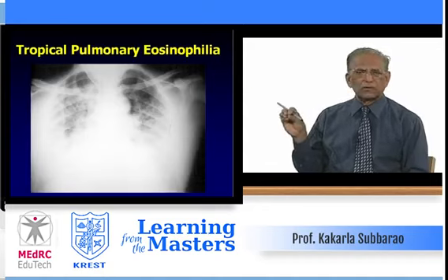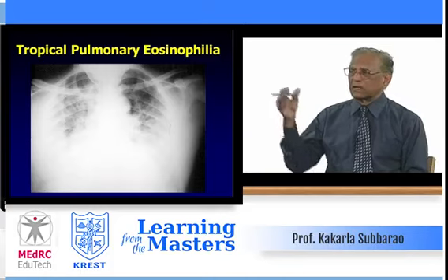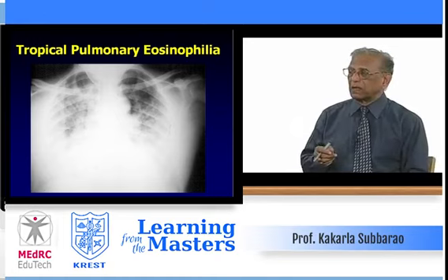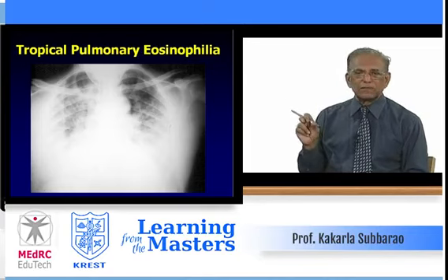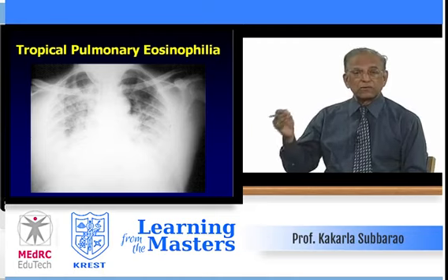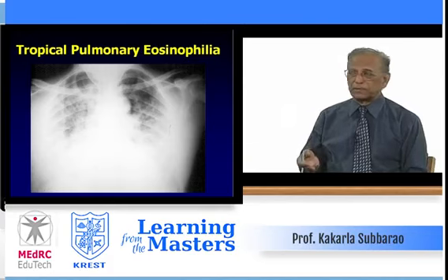This is a 25-year-old woman, comes with dyspnea mainly, loss of appetite, low-grade temperature, and this blood picture shows 70% eosinophils. And then amoebic, pulmonary amoebiasis, pneumonitis with cavitation in the right base. Note that the right dome of the diaphragm in the lateral segment is not well outlined. That should indicate maybe there is some infradiaphragmatic pathology, such as hepatic amoebiasis or hepatic abscess.